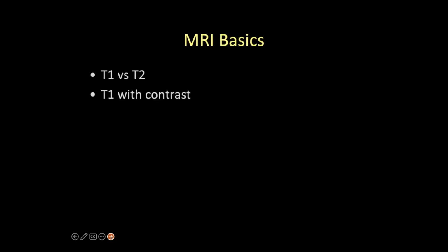So we will be focusing on MRI basics right now. T1 versus T2, and then T1 with contrast. And we're going to use Katie's rad path case to show these different sequences.